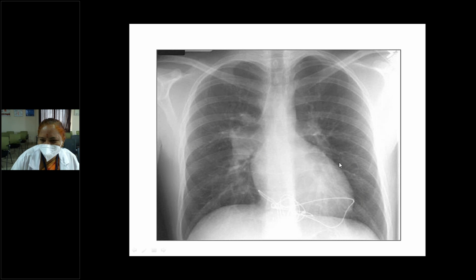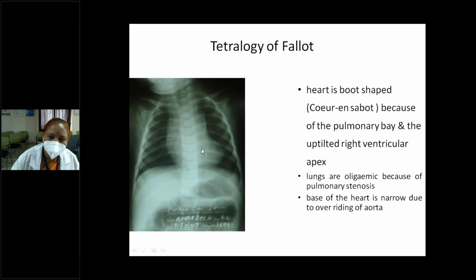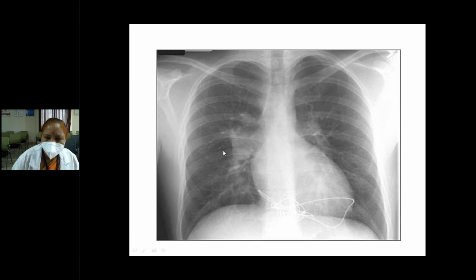Elevated. It's a left ventricular type of apex only. Elevated means it will be like this, like the previous X-ray. Okay. Right side, ma'am. What about bronchovascular markings? Just now I dealt with it. Increased bronchovascular markings, so most probably it's a pulmonary plethora. The previous X-ray was pulmonary oligemia. Here is pulmonary plethora. Actually, I showed this X-ray in the previous class also.